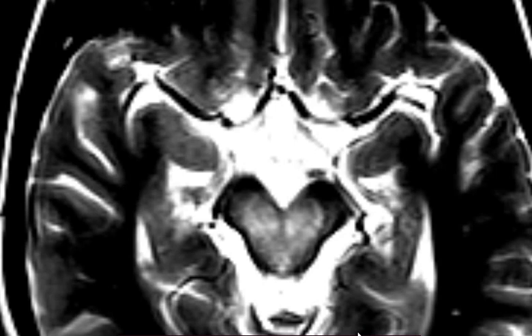As you know, right? Oh, sorry, my mistake. So, what else? Does anyone know what this sign is? No, that's multiple system atrophy, that's in old age, and this is a 12-year-old child.